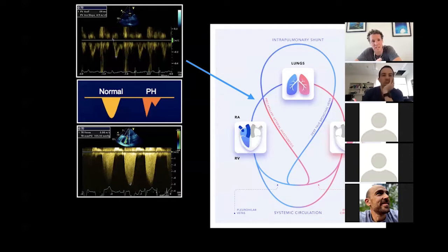The next thing I was going to say is that pulmonary acceleration time is actually probably the biggest marker of pulmonary vascular resistance. That's probably one of the best things to mention. Of course, it talks about pulmonary hypertension, but it's pulmonary vascular resistance that the pulmonary acceleration time reflects. I have 90 as the cutoff. I'm sure there are articles out there that talk about 100 being fine. 120 is definitely normal, so there's this kind of gray zone in there as well. And then that flying W is absolutely indicative of significant pulmonary hypertension.